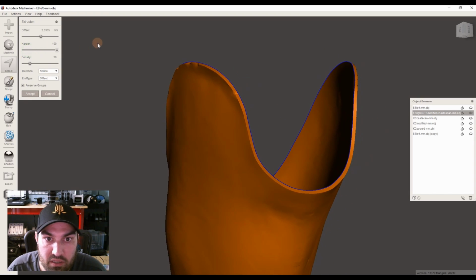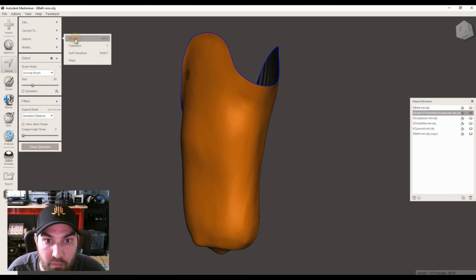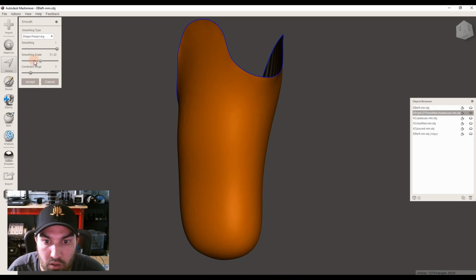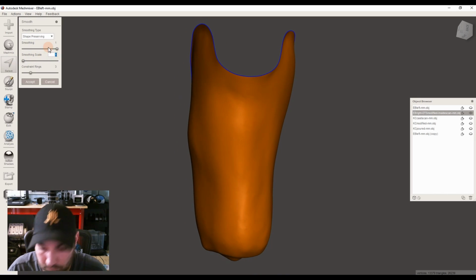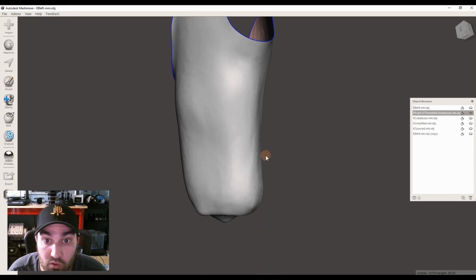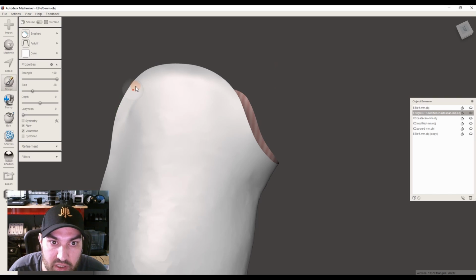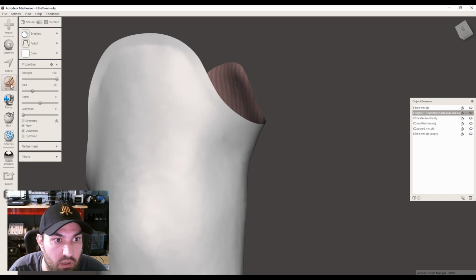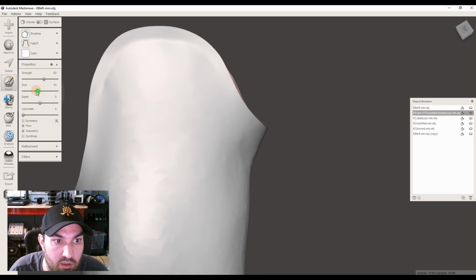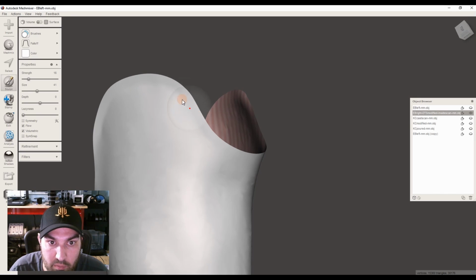So you see this one's still kind of rough, so we'd have some work to do there. We could also try further deforming. Again, don't deform too much, but we don't want to do that probably in this case because we're going to start losing our shape. So let's try that flatten tool and see if maybe that's the one that's going to help us here. And then I'm going to actually go with a low strength, robust smooth over top of that again, just so I don't have a crease anywhere. It'll kind of make it into a flare.